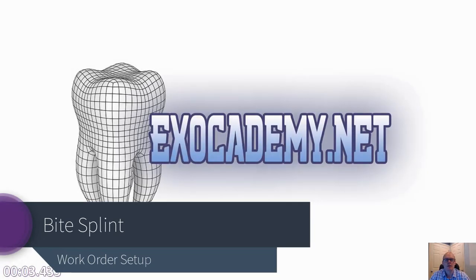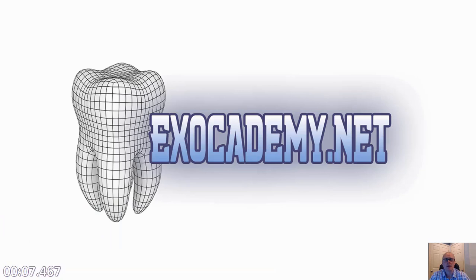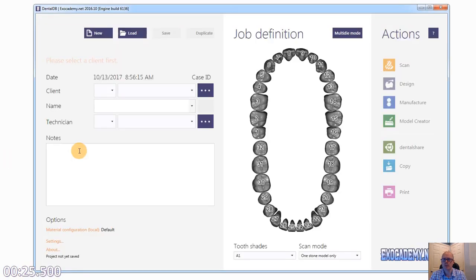Hello Exocademy. We're going to do a bite splint today in exocad. So we're going to take it from 2 scans, upper jaw and lower jaw, and take you all the way through design up to fabrication. So we're going to start exocad, dental DB, and start our order.